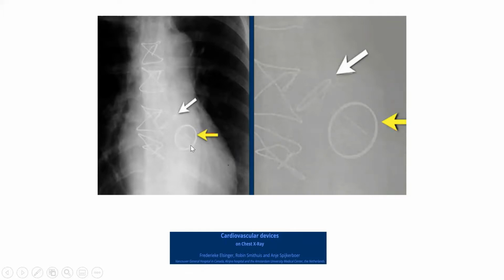The yellow arrow is the mitral valve, and the white arrow is the aortic valve. Yes, Mazen, you are right. So this one here is the mitral. This is the aortic. In zooming, the mitral and aortic, both are metallic valves. You see the sewing ring and probably the imprint of the disc here. So these are metallic valves.